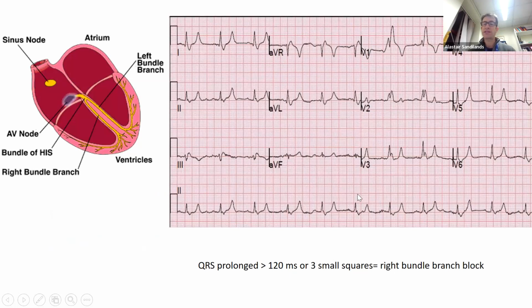Alternatively, we go through our basic algorithm again. Again, this is not a tachycardia. I'm trying to get you used to the bundle branch block signals so that if you see these typical signals in a tachycardia, then you may be able to diagnose SVT with bundle branch block.